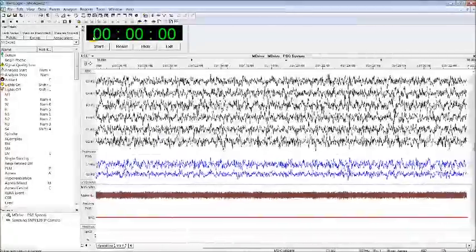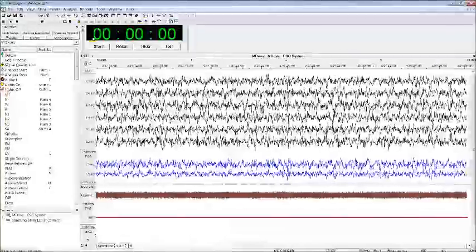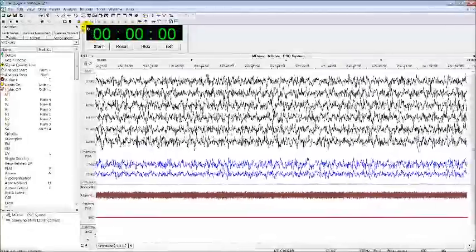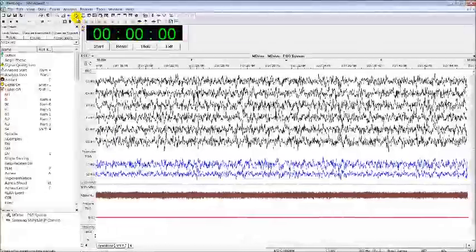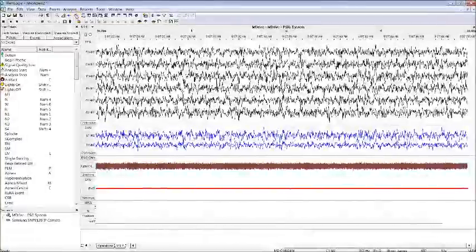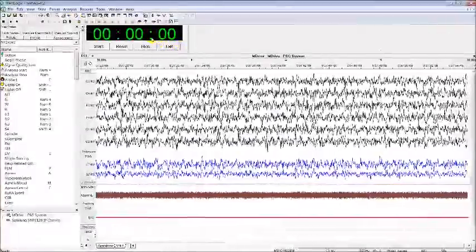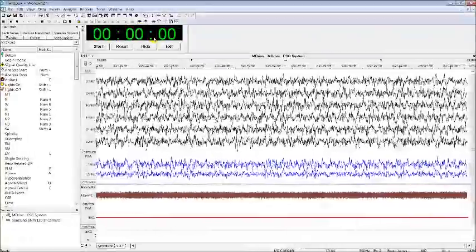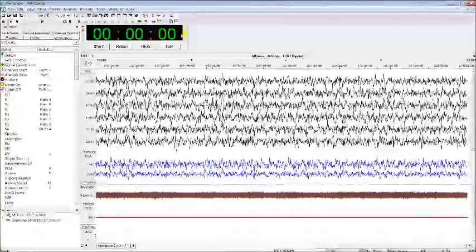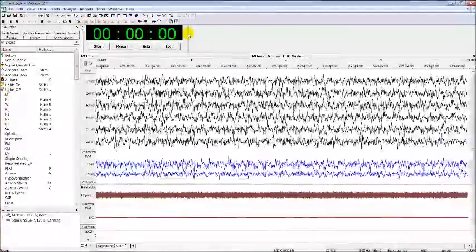One thing that I wanted to show you here is this little clock function, or we call it the timer function in RemLogic, where you can keep track of each of the naps, which is 20 minutes per nap. To get this timer out, you can click on this little icon here. I'll just close this, and then you can click on this and it will come up. Please do note that this timer is not recorded, so it is for your visual only. That means you can keep track of the total time that this patient has been in the naps respectively.